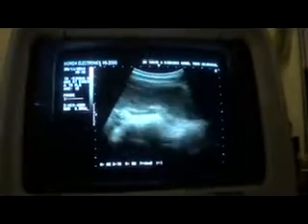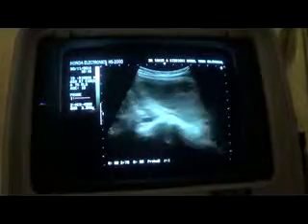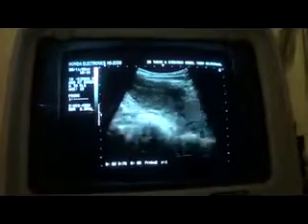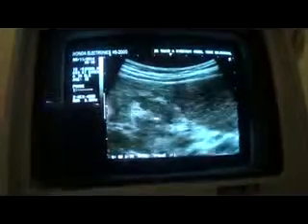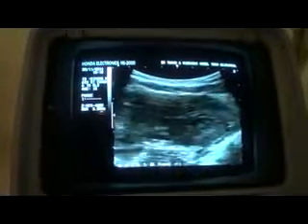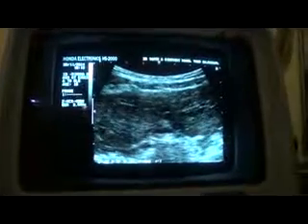So in fact it is one mass, but having extensions and expansions, with ascites, with cavernous transformation of the portal vein, and with matted bowel segments all over the abdomen. So this is our case of the day.